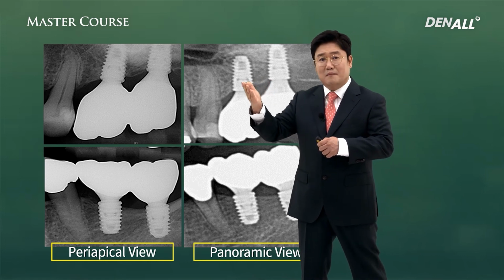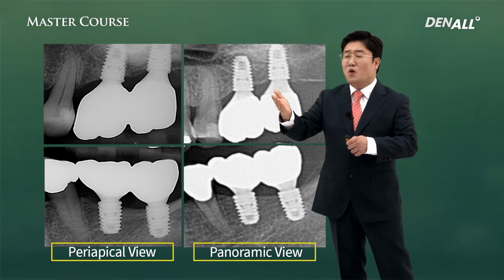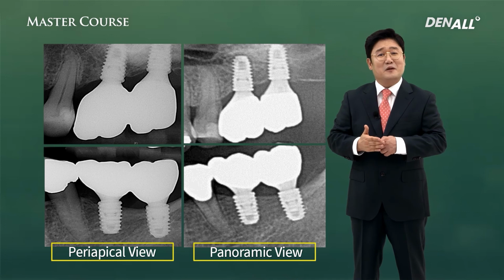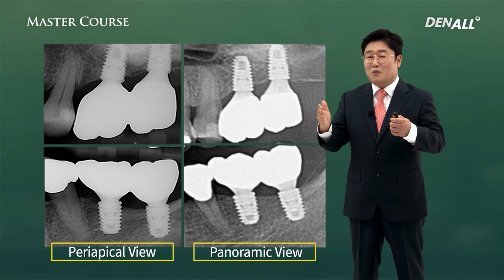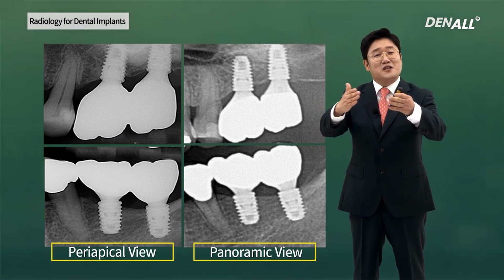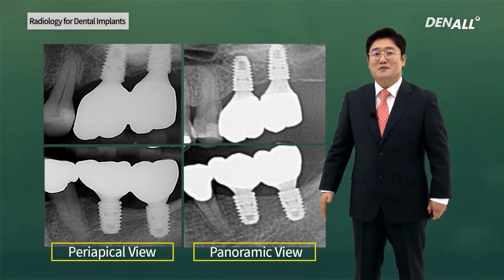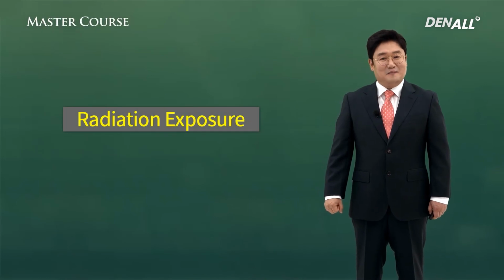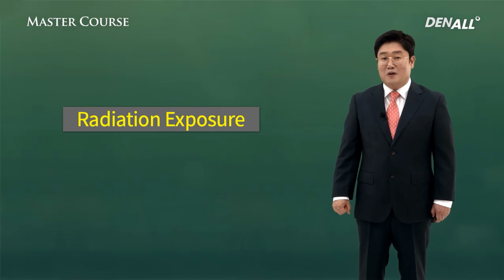On the X-ray, implanted fixture images, relation to bone, teeth are shown in details and clearly. Compared to cone beam CT, the information is limited. The coverage of the image is restricted. That's something we have to acknowledge. We have looked at CBCT, panorama, and standard periapical radiology.